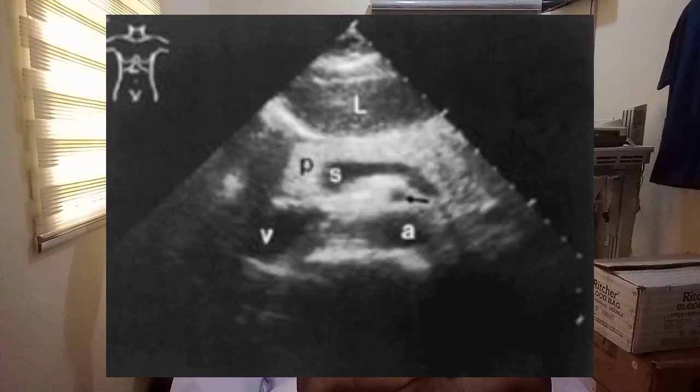Now this particular image is from an elderly patient. It's markedly echogenic, becoming essentially isoechoic with the fat at the root of the mesentery which surrounds the superior mesenteric artery. You can see the superior mesenteric artery is the black arrow. You can see it's isoechoic to the fat around that area. This is a consequence of replacement of glandular tissue with fat and represents a normal aging change.